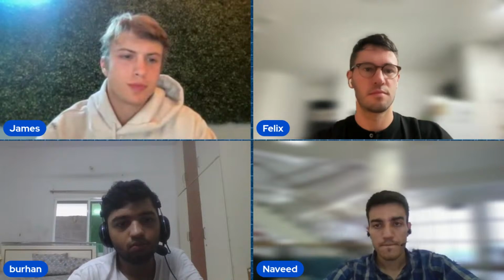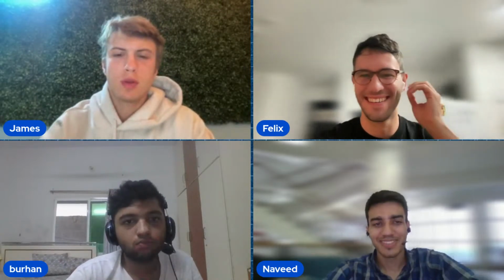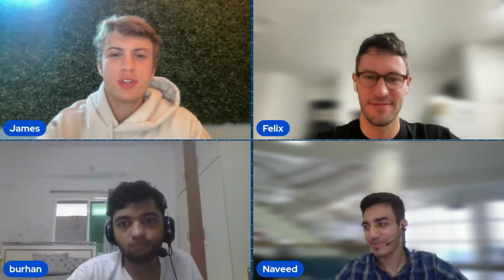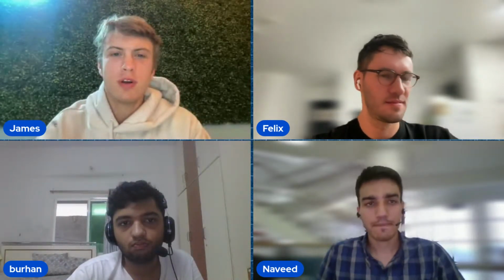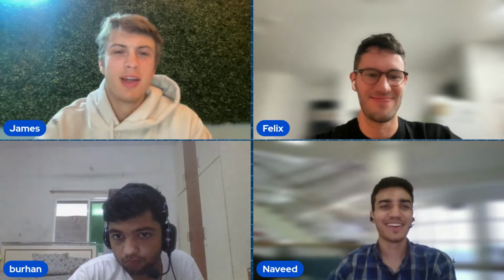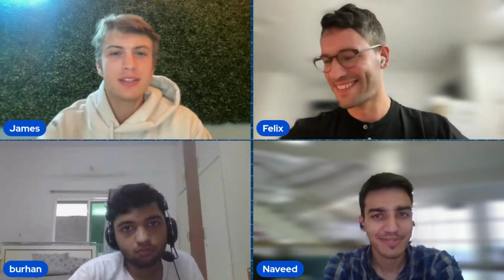All right. Well, at least we tried. It would get better. Unfortunately, that one's not going to work for the doctors. They're not going to be able to use this one yet. Doctors have to wait. No, you're fine. Model says you're good.